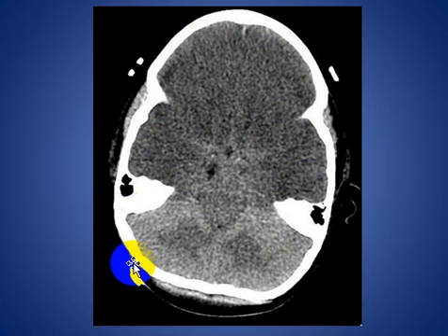And you see the bright cerebellum, it is not affected. This is diffuse hypoxic injury following status epilepticus.